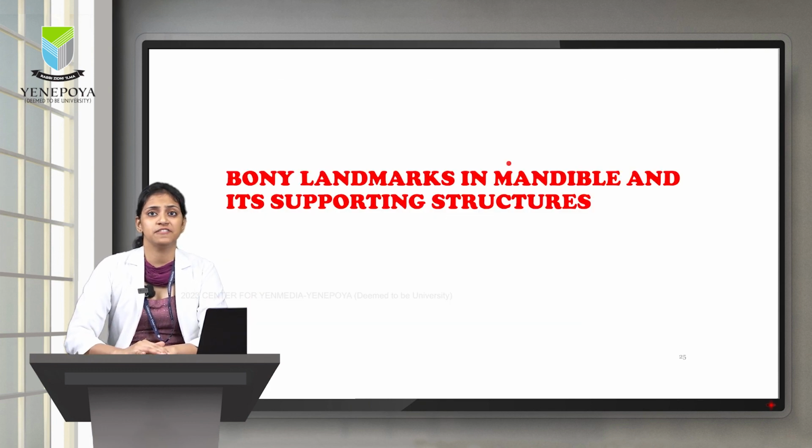We have now seen bony landmarks in the maxilla and its supporting structures. In the next few slides we will be looking at the bony landmarks in the mandible and its supporting structures.